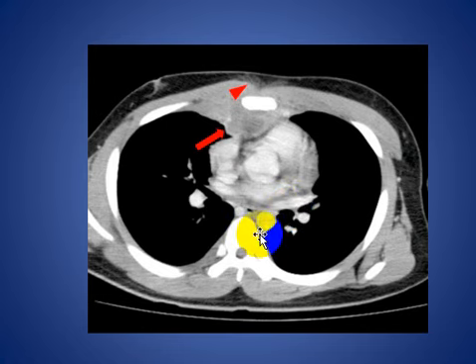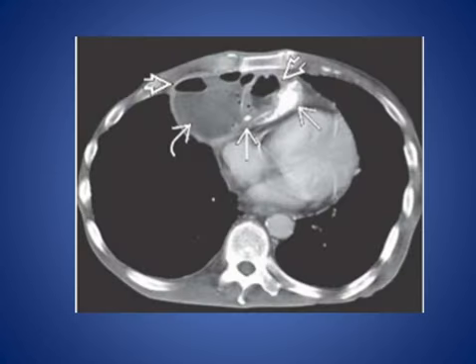Here, patient with blunt trauma to the chest, and we see here collection in the anterior mediastinum and soft tissue hematoma in this patient. Another patient with mediastinal abscess with air fluid level, and this is the gauze in the abscess, it is gossypiboma.